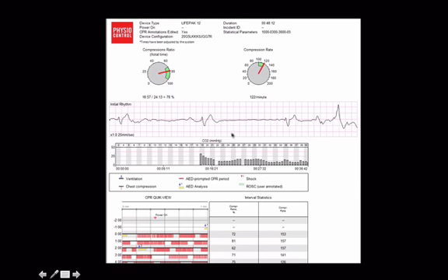If you are using the end-tidal CO2 on the LifePak, you'll see a readout of minute by minute what the average end-tidal CO2 was. This is somebody who was probably intubated somewhere around in here, and then the end-tidal was hooked up, and for the rest of the resuscitation you can see and trend the end-tidal CO2. This is only if you're using this through the LifePak. If you're hooked up to end-tidal CO2 through a hospital monitor or some other device, obviously it will not read in here.